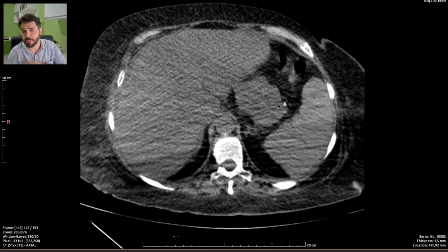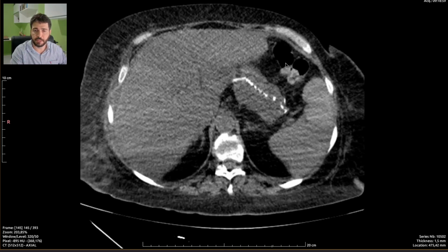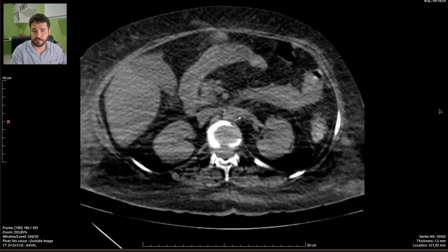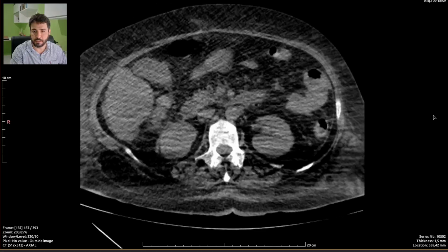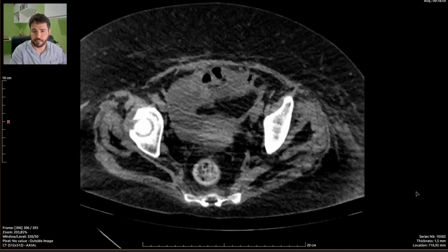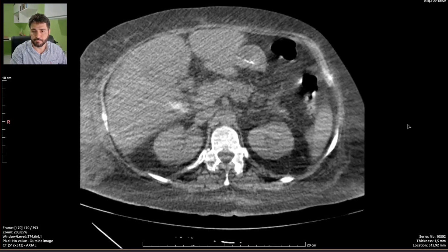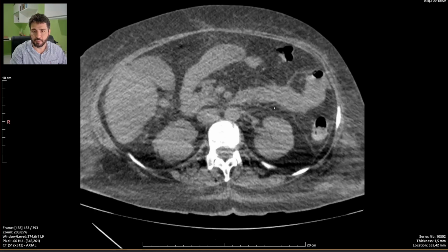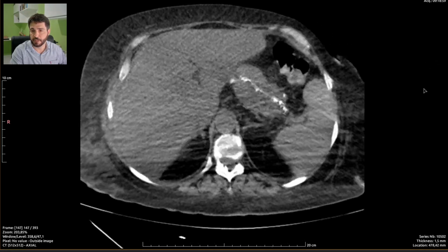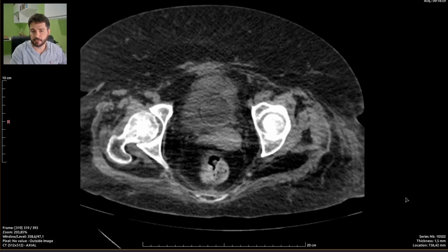I can also tell that this patient has had this surgery for quite a long time, because the gastric pouch is already quite distended and she is still heavily obese. So this is probably another case of gastric surgery failure on the second, third, or fourth year. We know after the first couple of years of gastric surgery, most patients gain back the weight. So it's usually a failure.